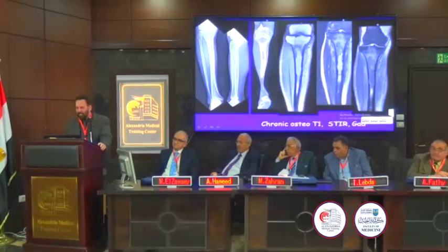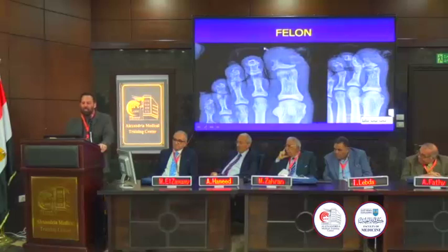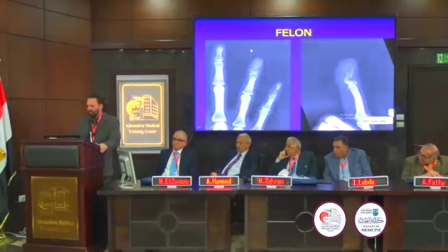So chronic osteomyelitis with involucrum. So here is a felon. Soft tissue mass and secondarily eroding bone and a lot of soft tissue swelling. So it begins in soft tissue as an infection, walls off because of the mass effect, decreases venous drainage, and leads to infarction.